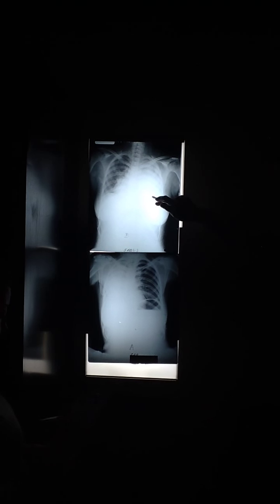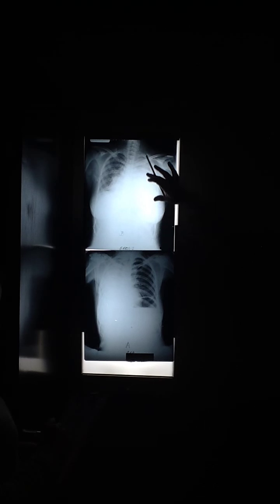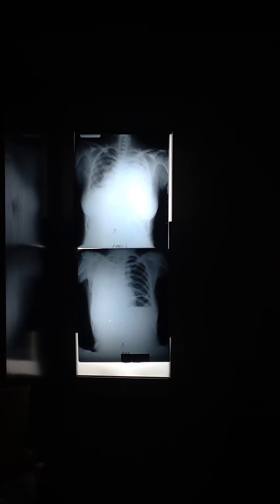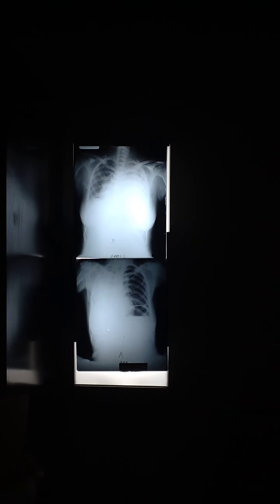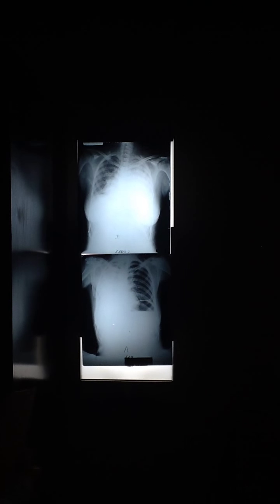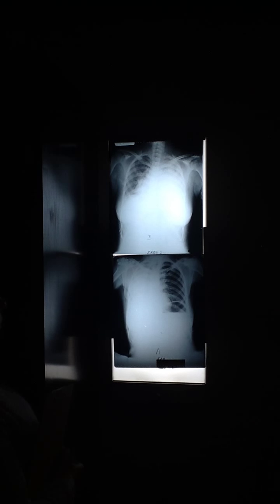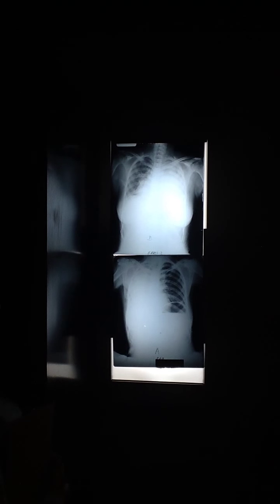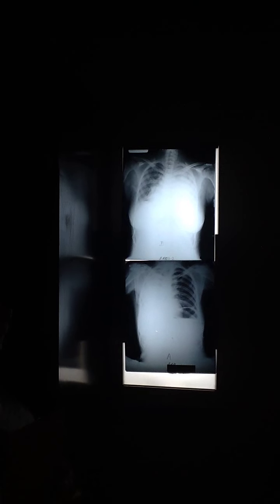This is a huge pleural effusion, probably infectious. This is probably a big mess of edema and exudate in there, collapsing the lung. How would that look different than hydrothorax? That is hydrothorax. Oh, okay. That's just kind of the generic name for it. It just means a liquid in the pleural space. This is the same thing as tension pneumothorax to the lung. It's just a liquid instead of air doing it. But it's the same problem. It's just with pneumothorax, you see the lung really clearly. But with this, you can't because it's silhouetted. Okay?